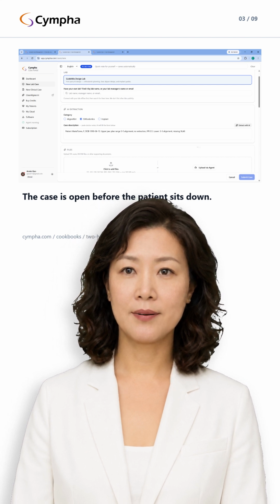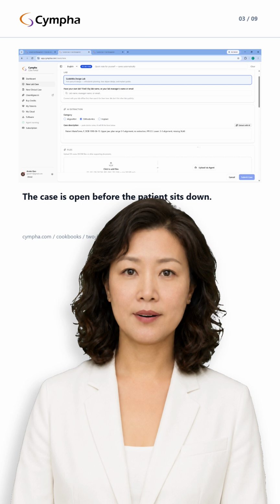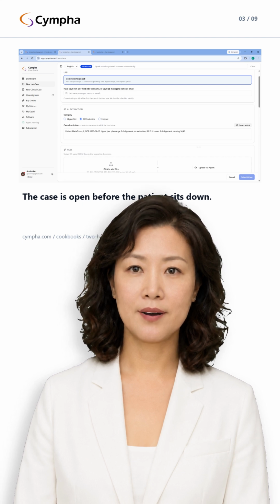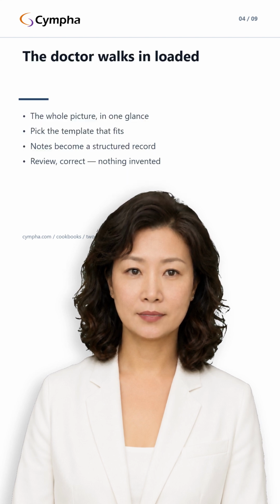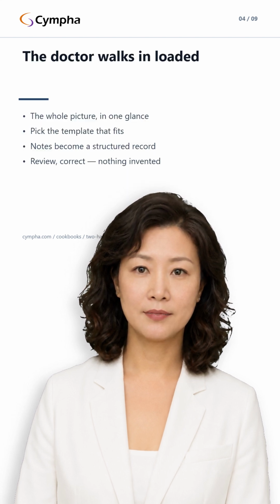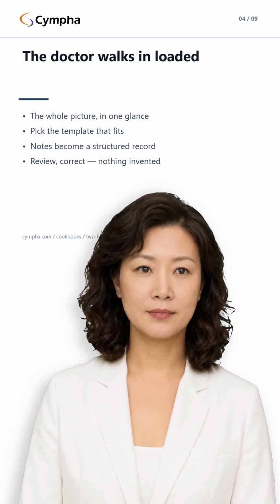It starts before the patient even arrives. Your assistant opens the case from the next name on the schedule. From that moment, the case is a magnet. Every photo, every scan, even a snapshot sent from a phone, all of it lands here on its own. Nothing to sort. Nothing to attach by hand. Now the doctor walks in, and the whole picture is already on screen.